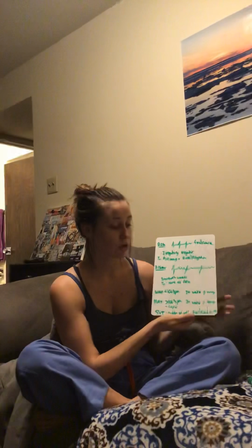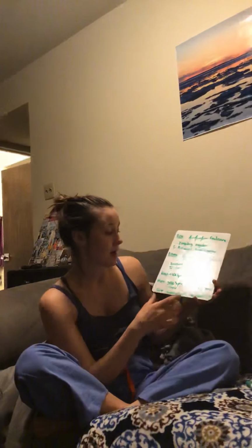So our last one that we're going to go over atrial dysrhythmia is supraventricular tachycardia. So supraventricular tachycardia, this sometimes can be difficult to discern between just normal tachycardia, but the one thing to know is that it has a very sudden onset. So if the patient is normal sinus rhythm and then boom, in the middle of EKG it gets really fast, that's how you know it's supraventricular tachycardia. It's also called sometimes paroxysmal SVT, so know that those are synonymous.